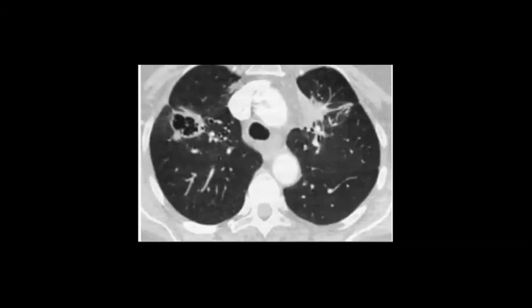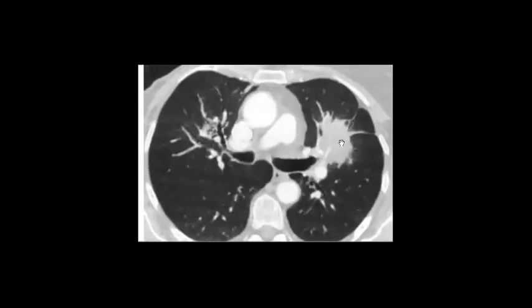Because it is a type of granulomatosis that affects the lung, and you can see a cavitating lesion in the right upper lobe, and a soft tissue lesion or mass in the left upper lobe adjacent to the hilum, with some retraction here on the pleural aspect, reaching the pleura, so it looks like a mass.